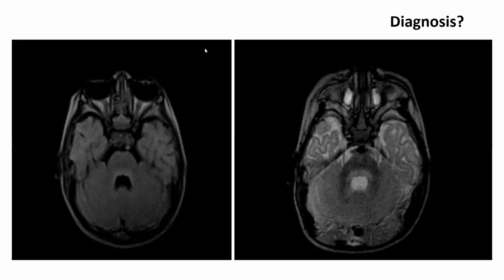Can somebody describe the finding? Even if you don't know the diagnosis, that is fine. What do you see in this picture? Yeah, Dr. Anusha, you can try.